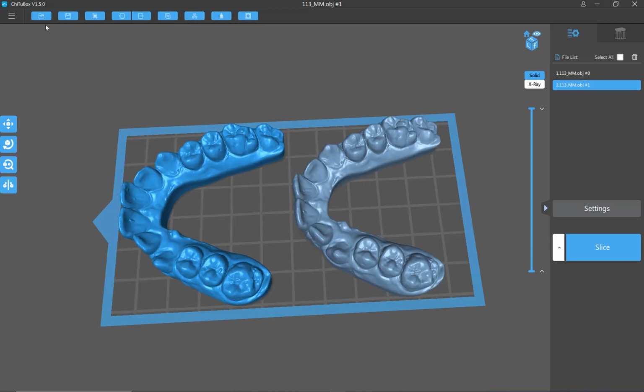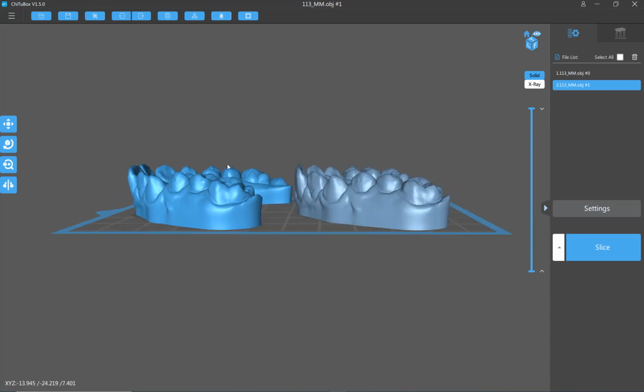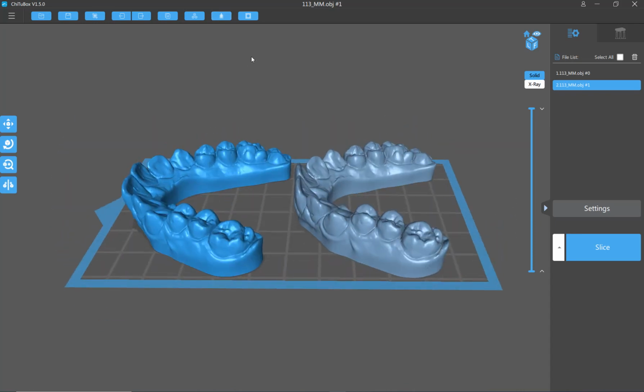We can duplicate and then align in the build platform. This kind of printer, which is called MSLA, tends to use cell phone screens to have great resolution, but they do tend to have a very small area. So you cannot print more than twice of those. You can also make it hollow and give it a hole for drainage. This is hollowing the model.